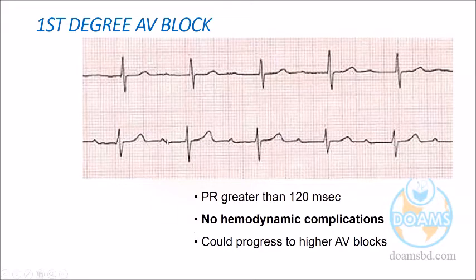And look at that. The PR interval here is fixed. It is prolonged and fixed, and there are no variations. You see, fixed means no variations. Another observation, though I will tell later: look here, this P is conducted by the QRS, then T, then again P conducted by the QRS.